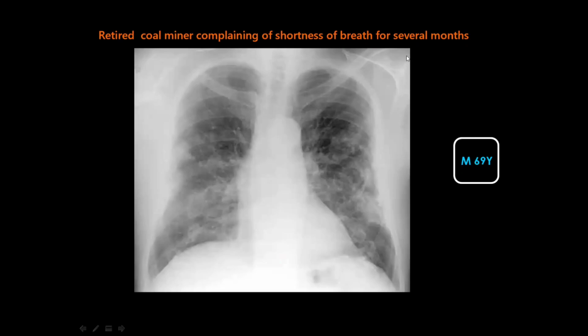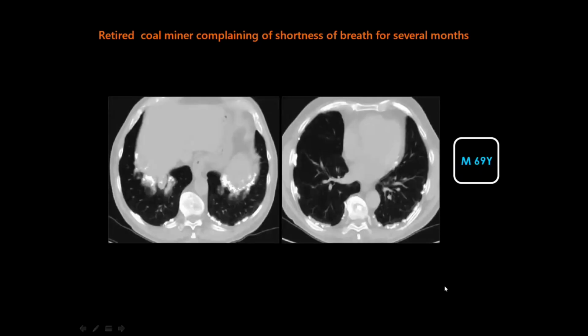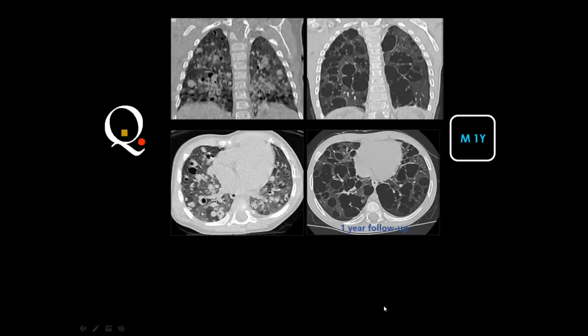Yes, right. And this is a good answer. This is pleural plaques. You should, as I have mentioned before, look to the diaphragm. And if you see some calcified plaques on the diaphragmatic copula, you consider all these opacities belong to the pleura, and this was right in the CT scan. You can see multiple calcified diaphragmatic pleura and the costal pleura as well, diagnostic of calcified pleural plaques.